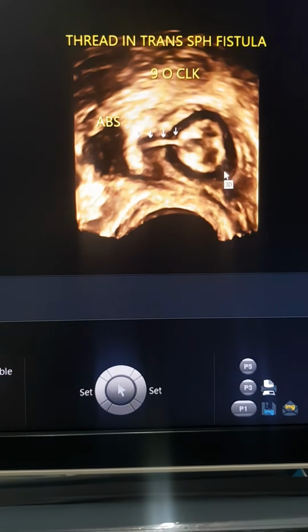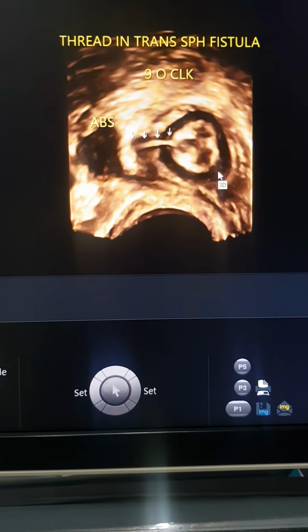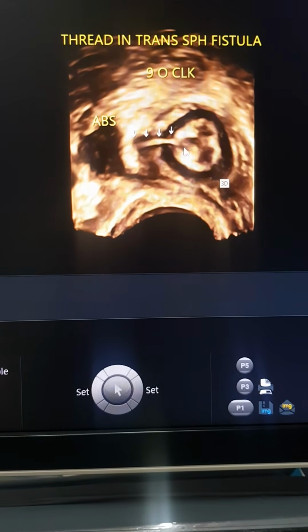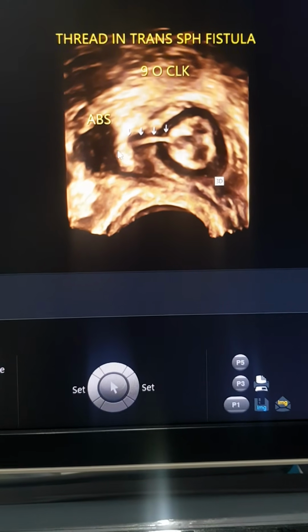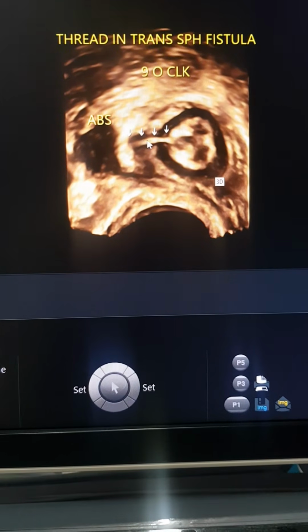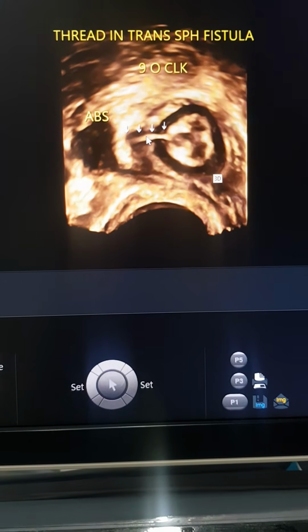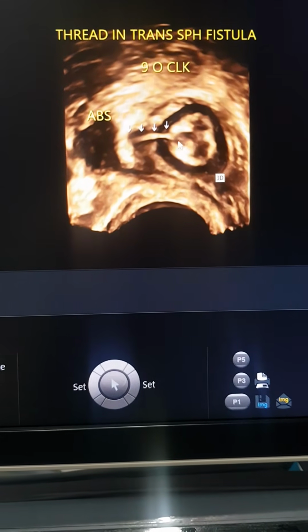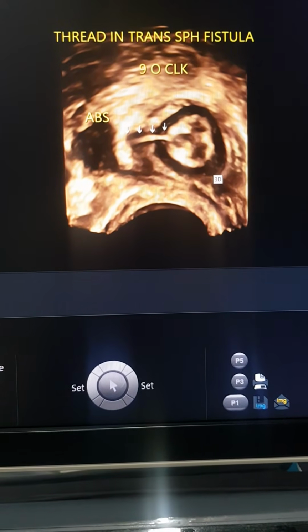From the 3D, I could do a rotational analysis. We got an axial of the anal canal from the 3D. So that's like the 2D. This is the ischioanal abscess in 3D. That's the thread coming from the abscess. That is where it pierces the external sphincter, that's the intersphincteric space, that's the internal sphincter, that's the collapsed anal canal, that's the thread going inside. So that was how the 3D could help us.